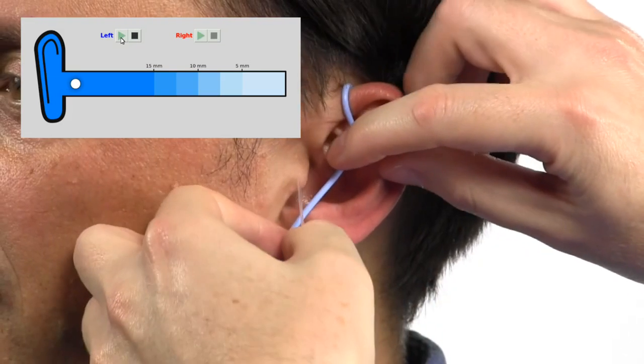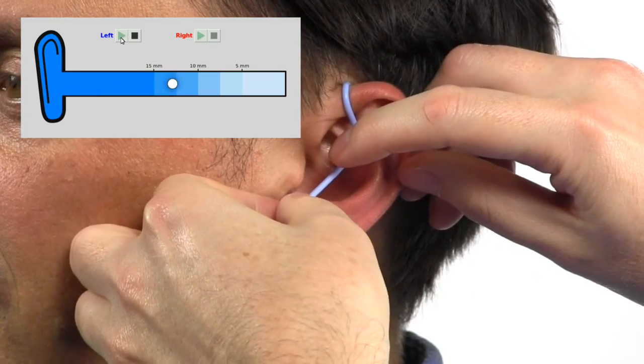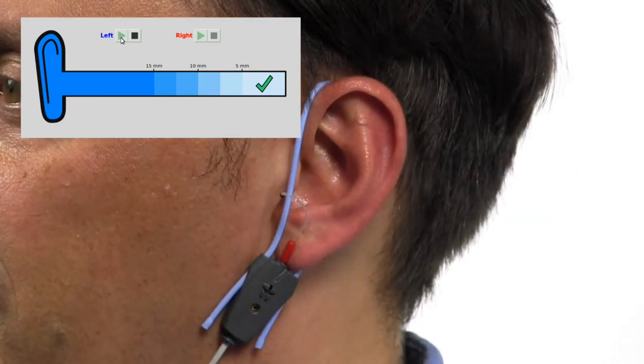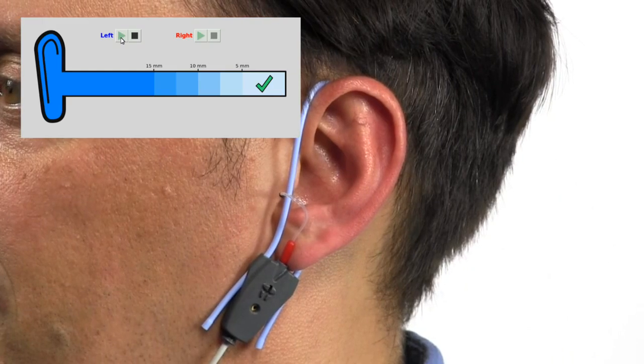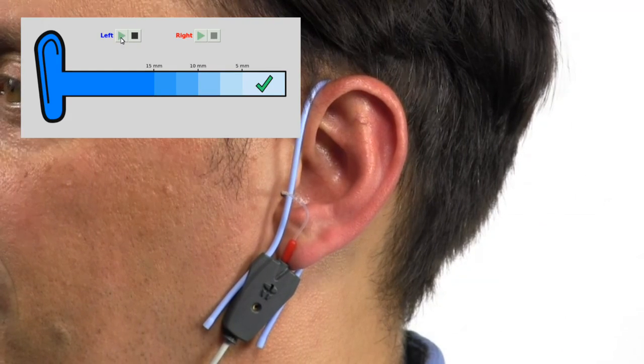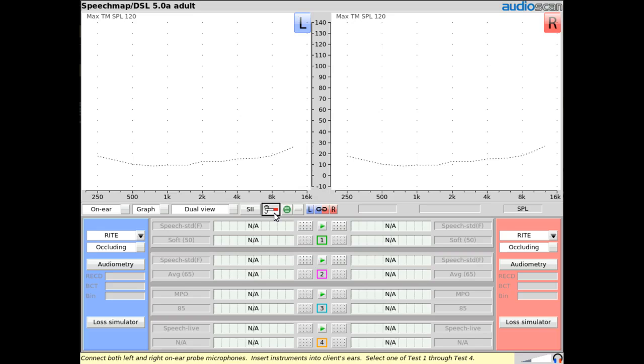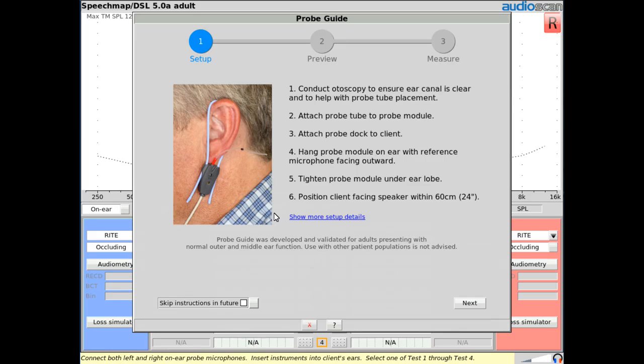The most eagerly anticipated feature of the 2019.2 release is the new Probe Guide software-assisted probe tube placement tool. This will be available in both Verifit 2 and Axiom and allows for quick, efficient positioning of the probe tube in the ear canal for real ear measurements. From any real ear test screen, click on the Probe Guide icon to launch the tool.